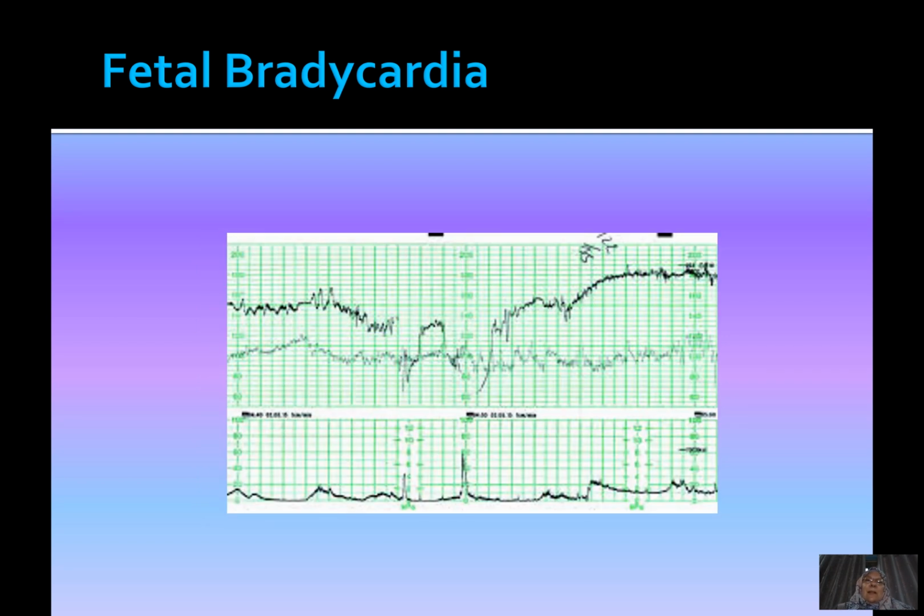So please have a look at this CTG and write down on your notepads what you see.